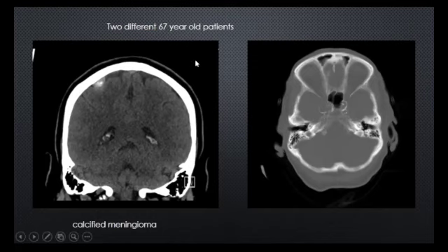This other patient, this ring-like calcification, you can see some of the calcification here on the other side. This is a typical appearance for a calcified rim of a cavernous aneurysm. So the answer to the Instagram case is, of course, the cavernoma of the brain. And I hope these additional cases will help you to understand the diagnostic features of a cavernoma.